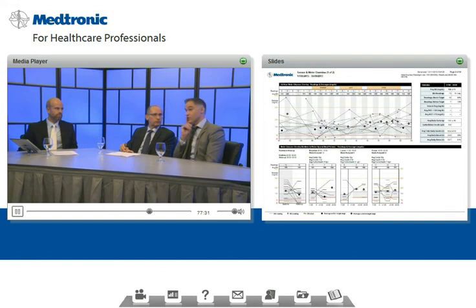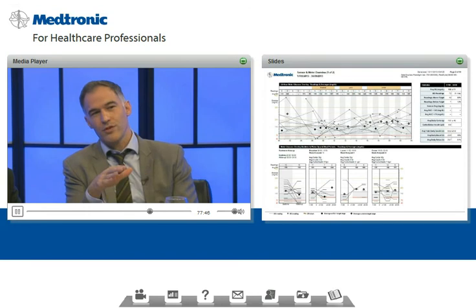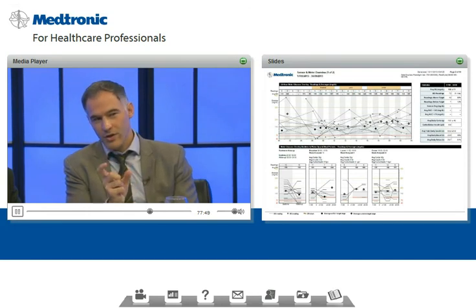You want to comment? Sure. Go ahead. Yeah, so the impression I have, most of the time, even on the top panel, you see when there's a sugar in target, the next one is generally high. Now when we look at the meal overlay, that's not always true, but it's certainly mostly true for dinner. So he's under bolusing for dinner. So either the carb counting is off or the carb ratio is off. And so we can have that discussion, see what's more likely, and make that change.